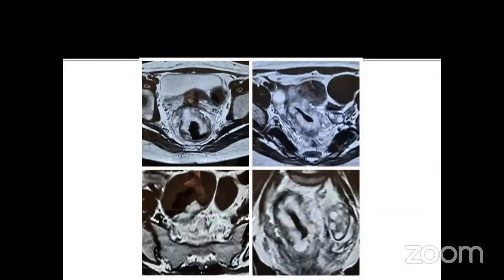Partha sir, sometimes when we were residents, a very common problem that residents often have is identifying the mesorectum, which you have very nicely highlighted over here. The concept of CRM and the substages of T3 have all been very well taken care of. And thanks to you that you have also included the tumor regression scores.